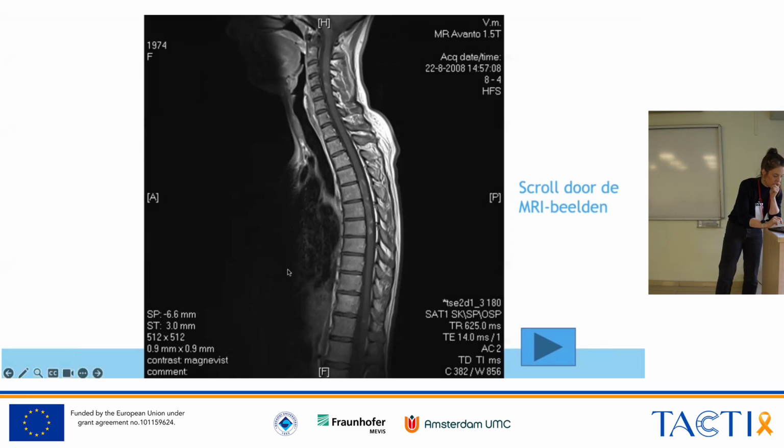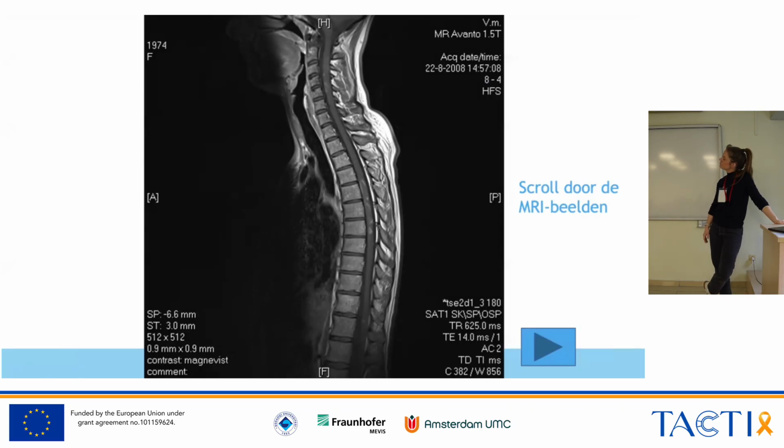Remember our border between the short lesions and the long LETMs, the long extensive transverse myelitis? We said the border is roughly 3 segments, so it's debatable if this is still considered short, but it can also be that those are several lesions that are confluent into each other. And then it all makes sense that those are MS lesions again. What is always good is to also have a look at the T2 or the STIR, because it shows you the lesions differently.